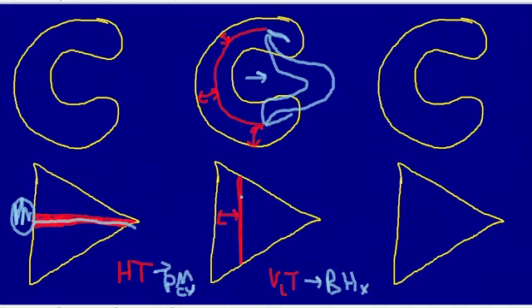Now, the vertical tear is interesting because this at times does have good solutions. You'll notice that vertical tears tend to be more peripherally oriented, so they tend to be closer to the red zone or the red-white zone. So more propensity for healing, and also more propensity if the surgeon wants to suture it together and see if it'll heal. So that's one of the advantages of a vertical tear.